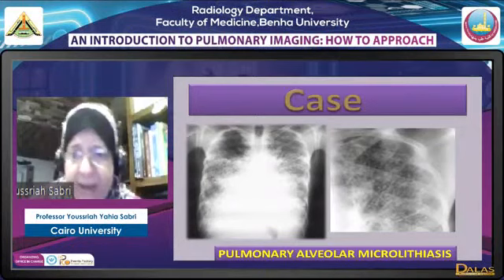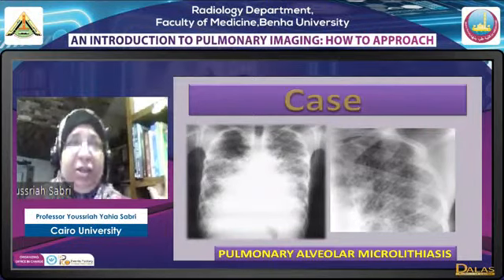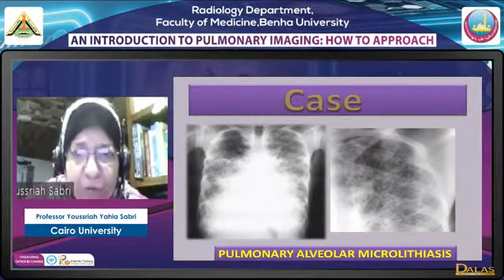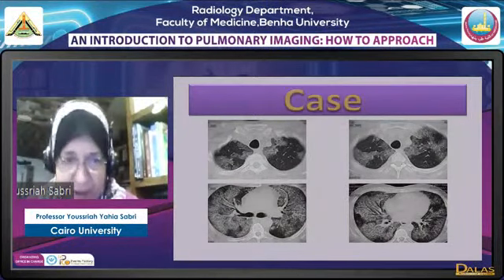It is a rare entity. Most of the time it's of unknown cause. Some people suggested a few years ago that it may be some sort of familial, but it hasn't been proved. Now again, we have a diffuse bilateral disease showing the classic crazy paving.